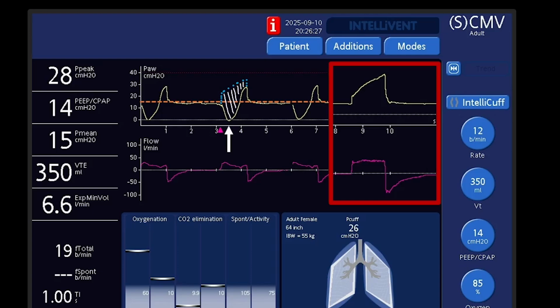The patient was exerting vigorous inspiratory effort in an attempt to receive higher flows. Since the ventilator controls inspiratory flows, flow will not rise in response to inspiratory effort, leading to this remarkable drop in airway pressures. This mismatch between demand and supplied flows is often called flow dyssynchrony.